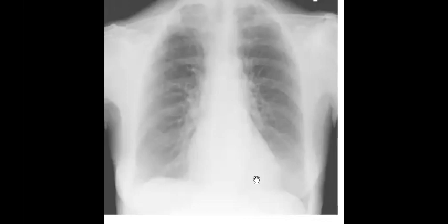Yes, Ala. Welcome, Ala. I don't know if it's your first answer. Nermin also, I don't see Nermin today. But at least we have distal erosion, Marwa, perfect. So Ala and Marwa, our big stars for today, we have distal clavicle erosions. Put it in your active list, then it's easy for you.